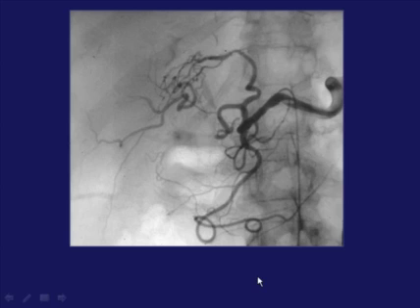So what was going on here? This patient had an angiogram, and you can see here's the catheter in the main hepatic artery. This is the gastroduodenal artery. And this patient had a complete thrombosis of the right hepatic artery. The left intrahepatic artery was supplying the right lobe via collaterals. And when vessels are recollateralized, they typically demonstrate a parvus tardus waveform, which is what was happening.